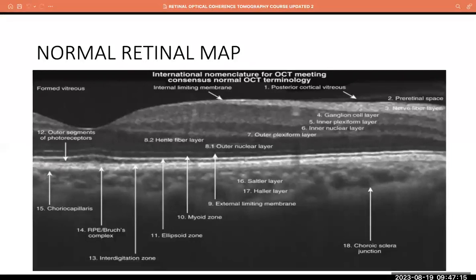So for macular hole, the ILM is peeled, and sometimes by different methods, inverted over the hole, or used as a plug into the hole, or peeled entirely for the layers to reconstitute. So that's just to point out that the foveola is devoid of some layers. Okay, so next slide.